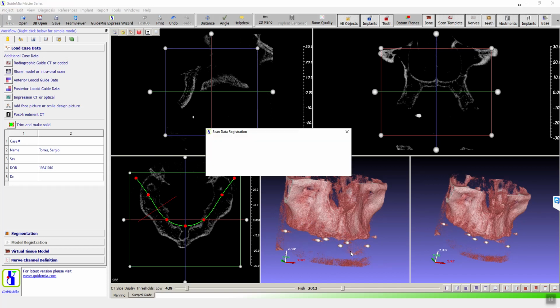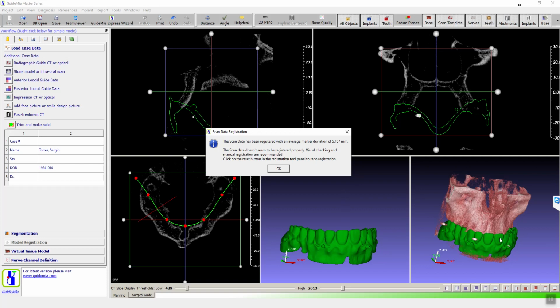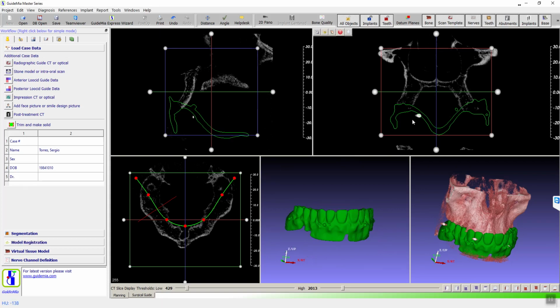In the first place, we actually flipped the markers, because when the left and right sides are about the same, it gives you a quite close match of the markers, but it is not right. So we're going to fix that later.